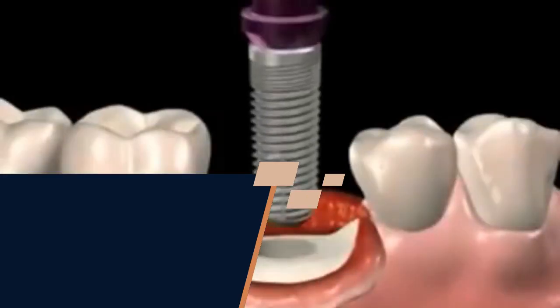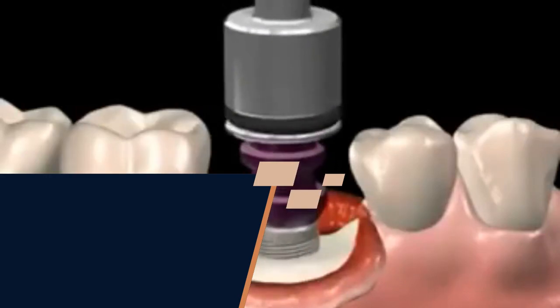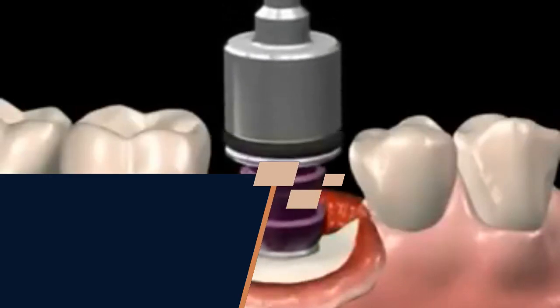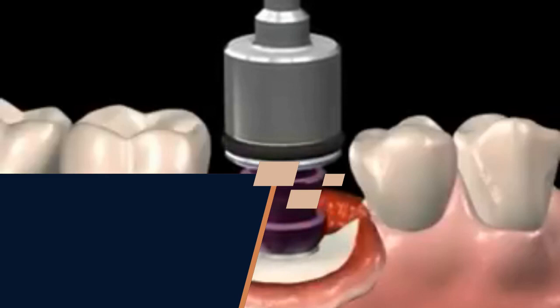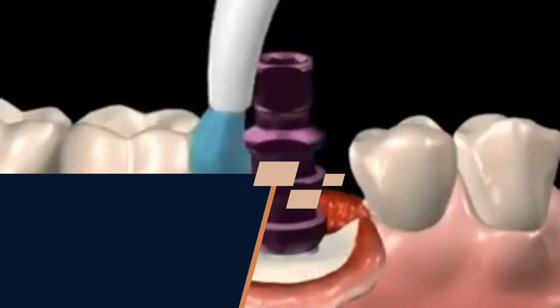Osseointegration. Over the next several weeks or months, the jawbone undergoes a process called osseointegration, where it fuses with the implant. This creates a strong and stable foundation for the replacement tooth. Abutment placement. Once osseointegration is complete, a second minor surgery may be performed to place an abutment on top of the implant. The abutment serves as a connector between the implant and the final restoration.